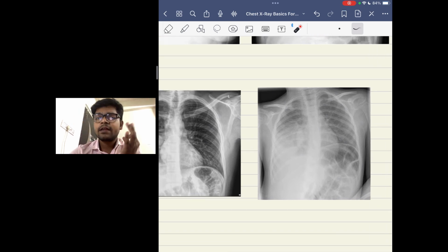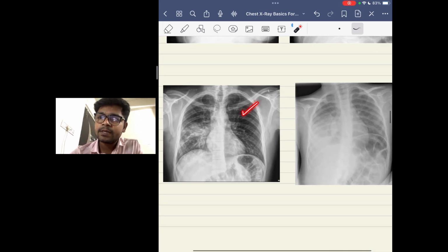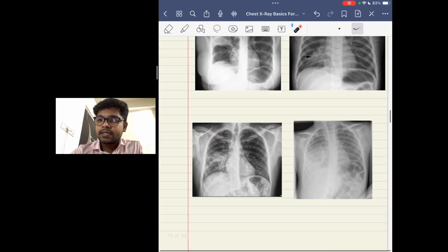In any X-ray anywhere in the body, we always need two views of that organ or of that image of concern, because it is a 2D thing. The X-ray plate is a 2D thing. We cannot appreciate the exact location of a pathology unless two views are given to us. So mostly we are given this PA view, so we are discussing that. Is this clear by now?